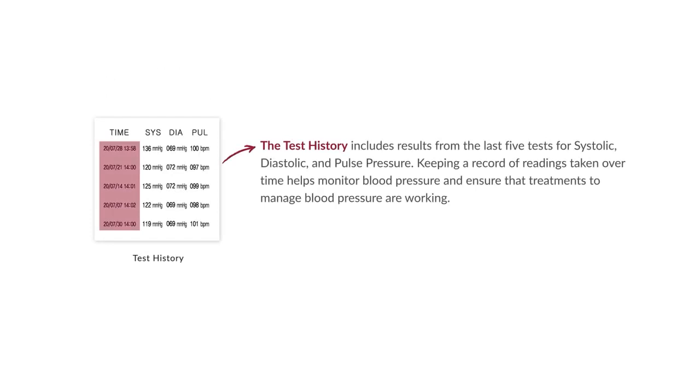Finally, the test history includes results from the last 5 tests for systolic, diastolic, and pulse pressure. Keeping a record of readings taken over time helps monitor blood pressure and ensure that treatments to manage blood pressure are working.